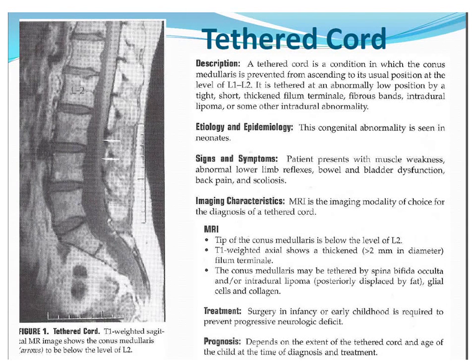So you may end up evaluating this late in the process, or sometimes you may be evaluating this in a patient who was screened by ultrasound first and found an abnormality. So there's nothing additional that you need for this. You don't need any contrast or anything like that. I guess the most important thing, if you're dealing with imaging a child or a baby, is just to make sure that you have nice still images so that you can see these kind of subtle findings.